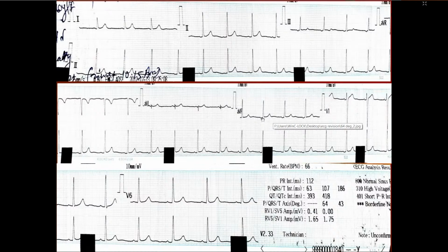Now here is the catch. So we are around plus 60 degrees. Now how will you calculate? You will refine your answer. If you say 60 degrees, you will get full marks. But if you see, R of lead 1 is very tall, positive, no S wave, but R of lead 2 is even taller. It is almost double the R of lead 1. So I will add around 4 degrees more. I will say it is not 60, because lead 2 is pulling the electrical vector towards itself, towards the right side, towards the RAD side. So from plus 60, it is pulling like this.